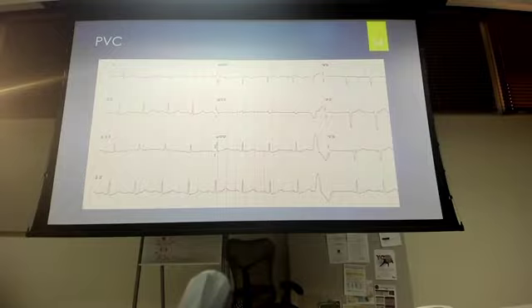On ECG, it's going to look like this, where it looks fairly normal, but when you look at that bottom rhythm strip, one thing should really stick out from the very beginning: whoa, what is that thing? That's a PVC. It looks like it hurts. That's a premature ventricular contraction, a heartbeat that's occurring earlier than normal, and big and wide because it's coming from the ventricles.